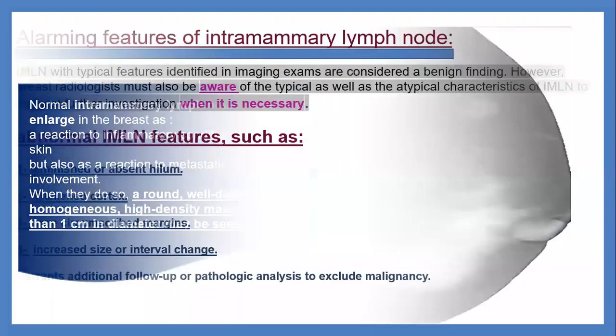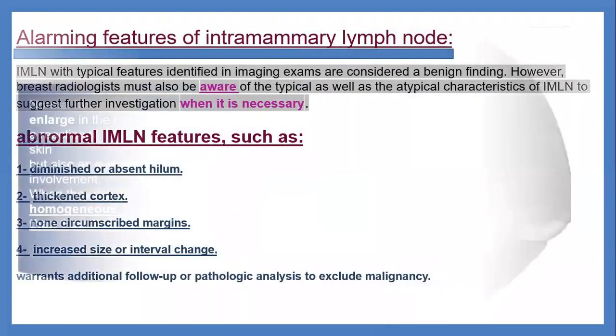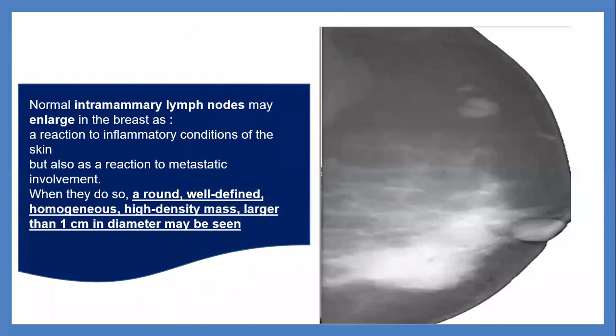What are the alarming features telling you the intramammary lymph node is not a normal lymph node, not a typical or benign lymph node?